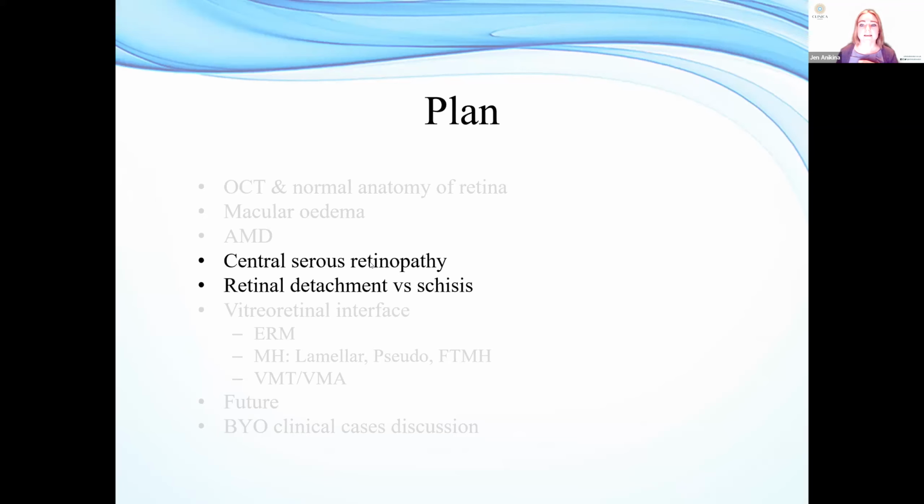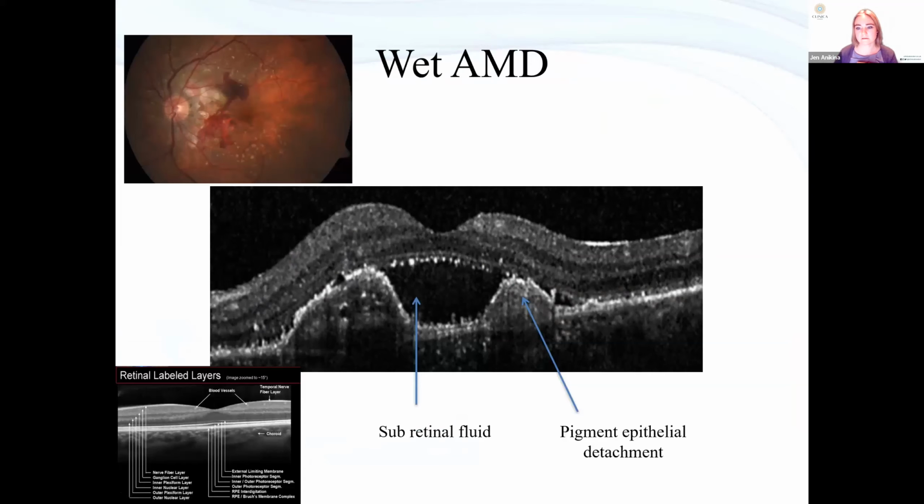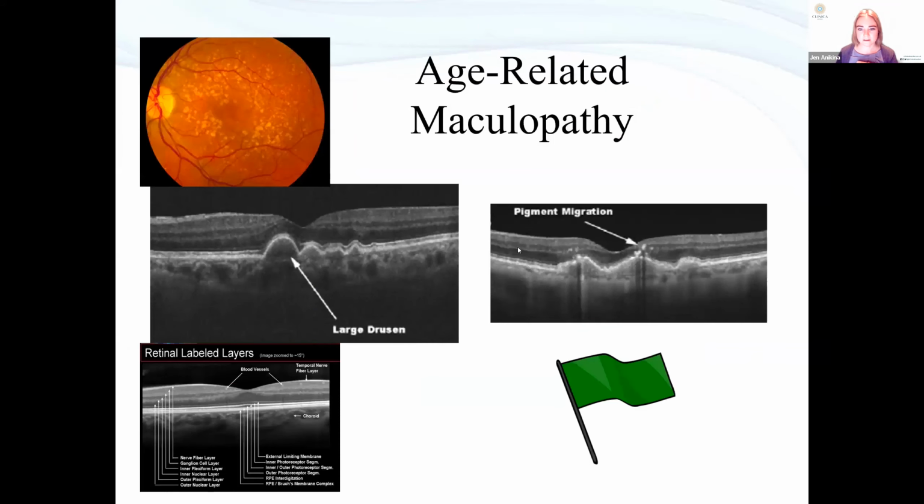Yes, the little section. Now, this question, I'm going to actually go back to the slide it relates to. I know exactly what you mean. I know exactly the slide you mean. There is a little black space just there, and on the next slide as well. How do we know that's not fluid?